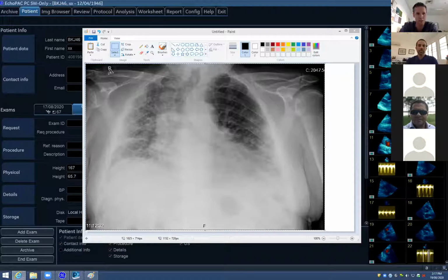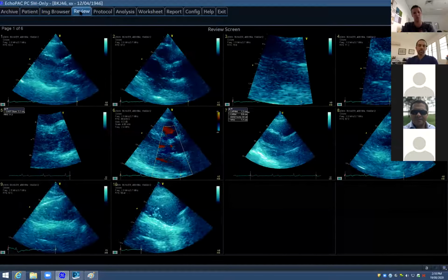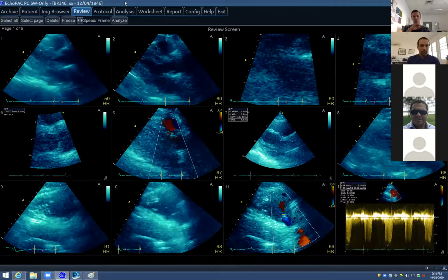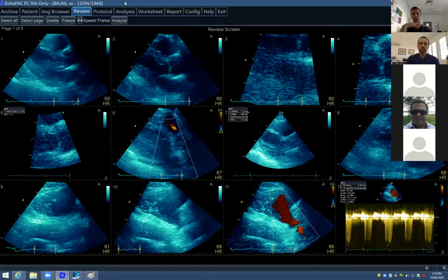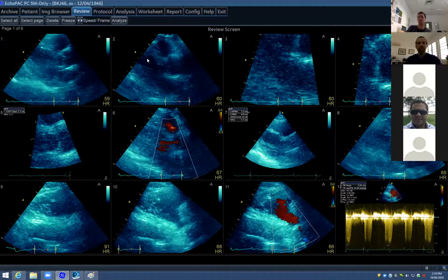All right, so let's start off first of all with his echo. He had an echo done on the 5th of August, so that's a good 2 weeks ago, and this is where I want us to start. So I'm taking us back to when that chest x-ray was done. This was this gentleman's echo. He has no major findings on his biochemistry. He's got normal renal function, normal LFTs, and the echo I'd like us to go through a little bit. So again, this is 2 weeks ago.